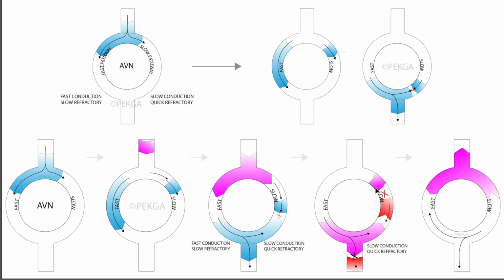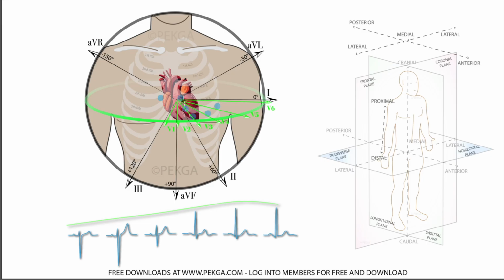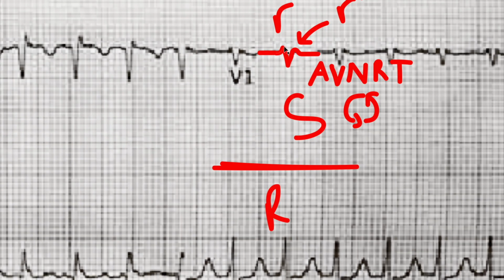I'd love to show you a couple of real-life examples, but essentially what this boils down to is where you are going to be finding your P wave after the QRS. So in this case, it's coming immediately after the QRS. So it's telling me that whatever's going on here, it's happening almost instantaneously, right? So as the ventricular depolarization is happening, so is the atrial depolarization.